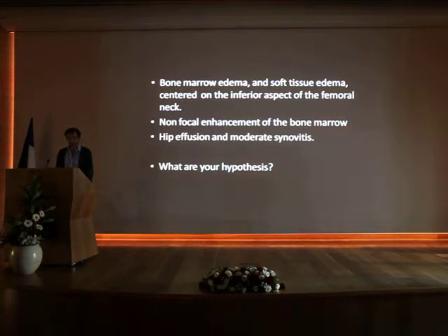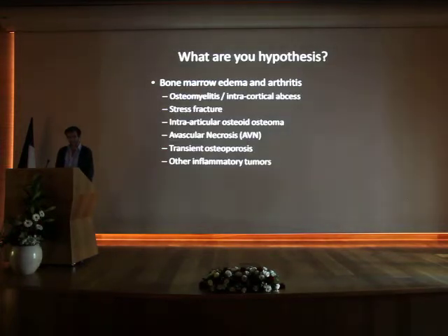So what are your main hypotheses in front of this imaging? This is what we have evoked. First, an infectious etiology, then a stress fracture, intra-articular osteoid osteoma, avascular necrosis, transient osteoporosis, or other inflammatory causes. So we shall briefly discuss these hypotheses.